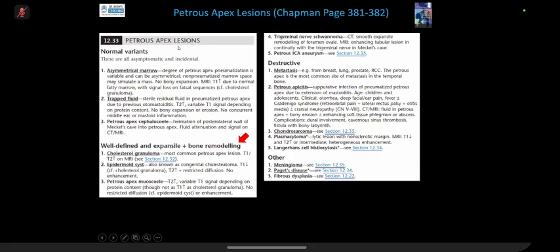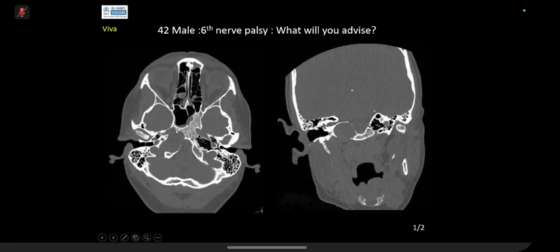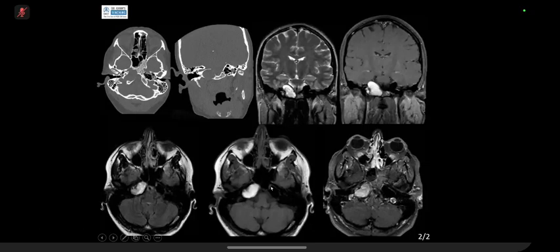So for a petrous apex lesion, there is another differential diagnosis. And the most common petrous apex lesion is T1 and T2 high signal. Remember this. This is another example where there is expansion of the bone, much more than in our case. On a T1, this is high signal. On a T2, you can see a rim of low signal here, which can happen because of the granulation tissue. On post contrast, it might not be very helpful because it is inherently high signal on T1.